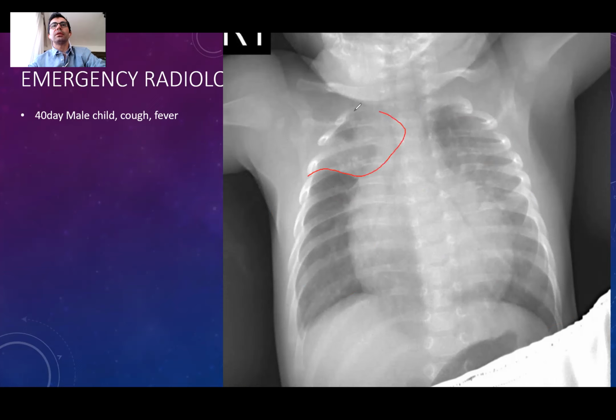Also, I'm seeing this area, right? What is this? There is a focal density on one of the lungs, on the top of the lungs also. These are two things I mentioned. One of the doctors said cardiomegaly. This is normal for a newborn baby. Newborn babies' hearts look like this. Also, the mediastinum is usually quite wide. This is quite wide for a grown-up, but this is normal for children. Usually children have a thymus as big as this. So these are within normal limits.